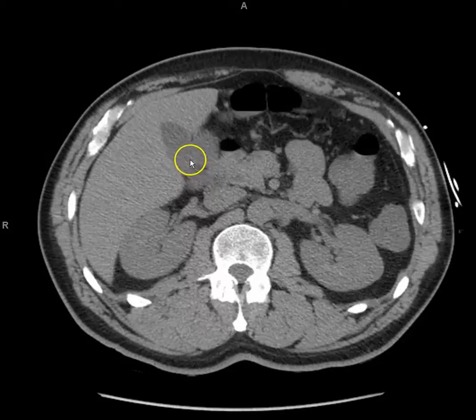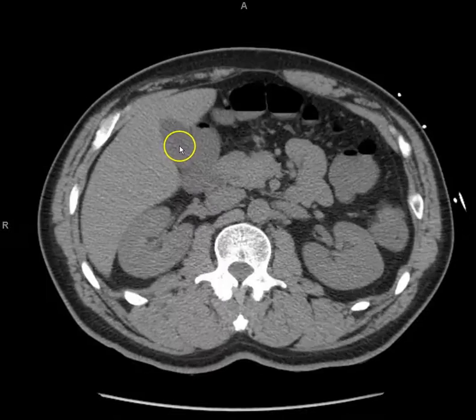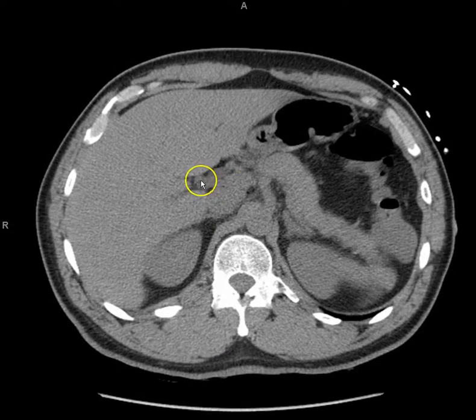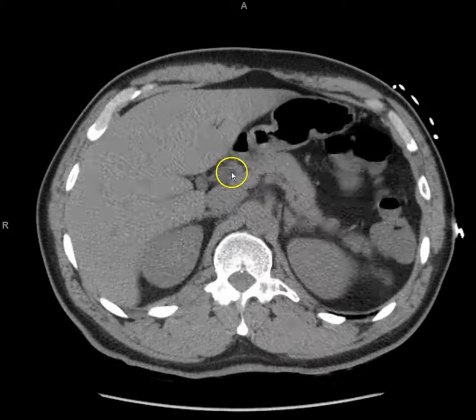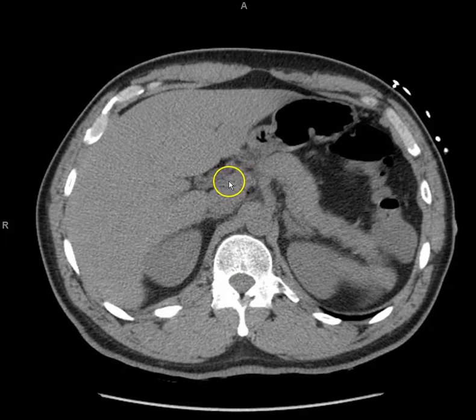Okay. So this is the liver still. What is this organ here? Gallbladder. That's right. And the gallbladder connects to this system here. What is that? Bile duct. Which more specifically is probably the common bile duct here. What is this? And I will tell you it's a vessel.